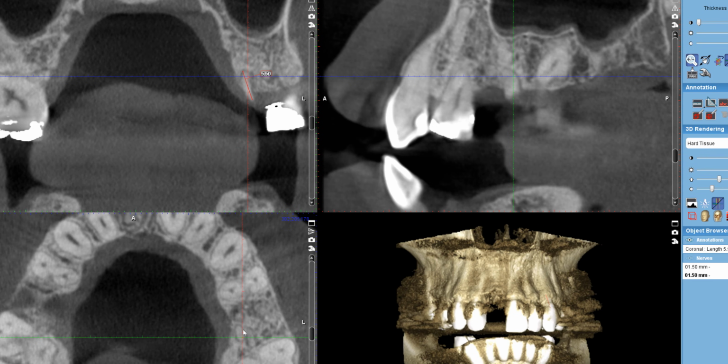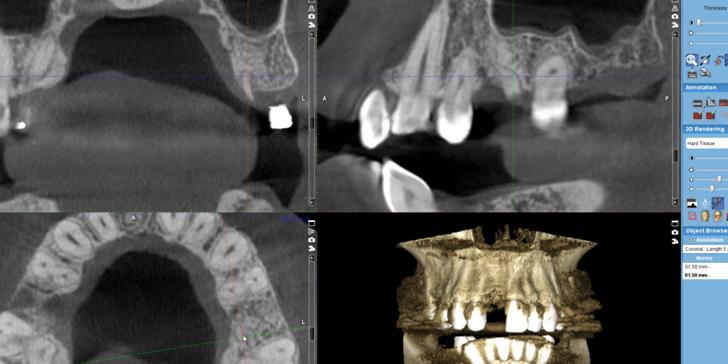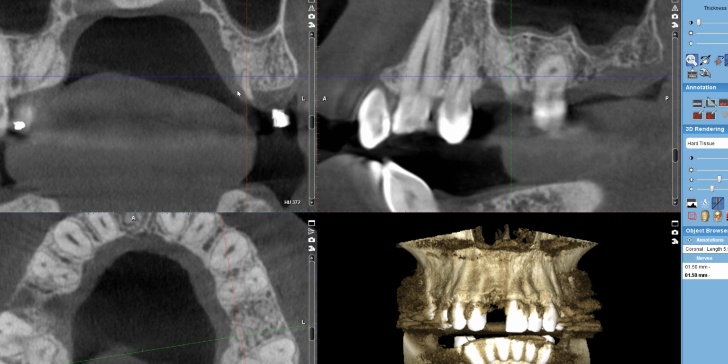Again, it's just my hypothesis, but at the time of the dentist doing a root canal therapy, he or she expected perhaps a single root only, and then the person managed to fill a single canal, but perhaps not the other, which may have led to the failure of the root canal treatment. And now here we are with extracted tooth, but again with a retained root tip. So this needs to be again taken care of before placing a dental implant. But otherwise, this ridge now has healed beautifully besides this root tip.